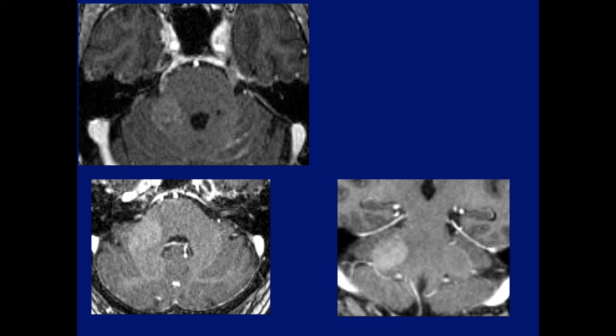What is the abnormality in this case? And what condition may that be? Any other responses?